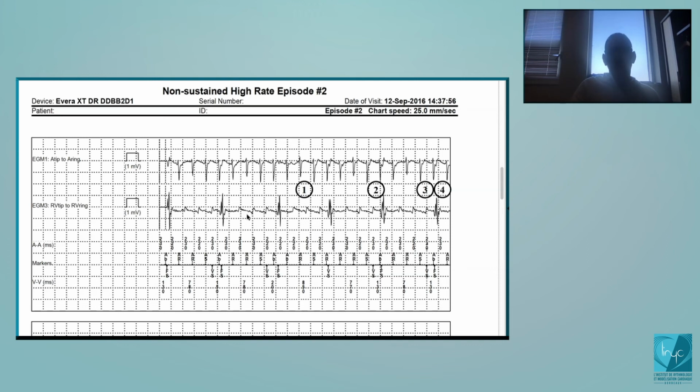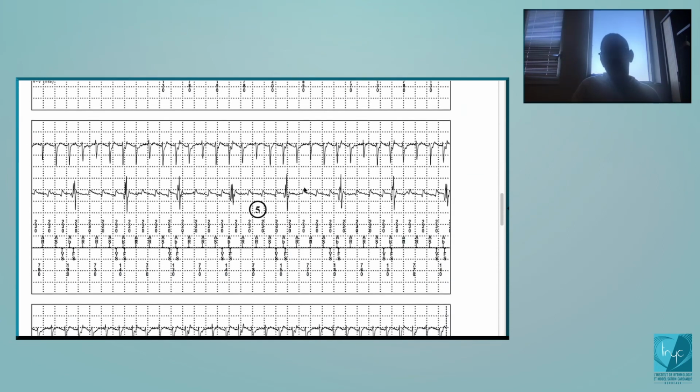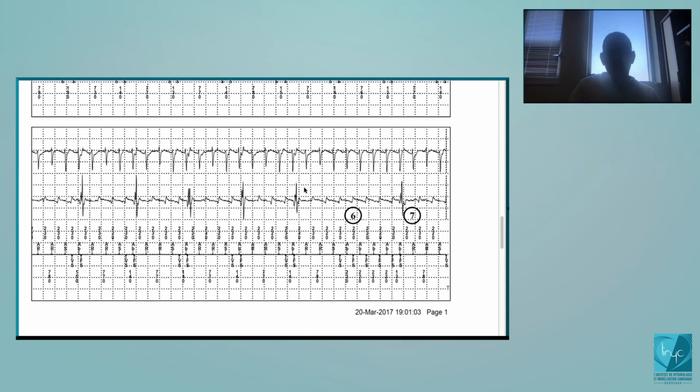Well, the amplitude seems a little bit. Oh, no, it's systematically this one. Okay. There is an increase of the sensitivity along the cardiac cycle. It's adaptive. You start at a percentage of the RWA, but then you increase the level of sensitivity. So, of course, there's more chance to oversense this one than this one or this one. Okay, so this is atrial activity oversensing, and then what happens?